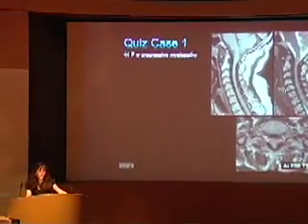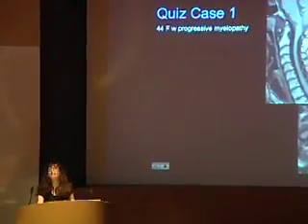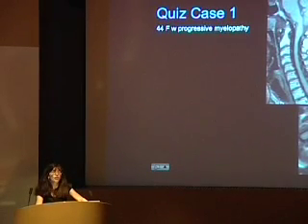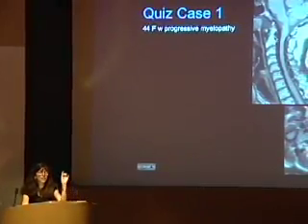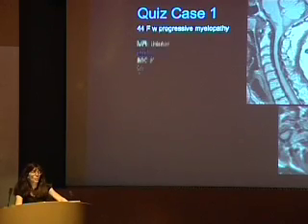So what else are we going to come up with? Okay, so lipomatosis, except it's not fat. But that's a good thought. Absolutely, fat in the epidural space can cause severe cord compression and myelopathy. So you need to think about some other sort of deposition or infiltrative process. So maybe it's amyloidosis. Okay, that would be a potential thought. What else could maybe do this? Rheumatoid arthritis. Okay, so rheumatoid arthritis with ligamentous involvement. You might expect to see a little more whittling of the dens, but you could actually wonder if her C1-2 interval was a little bit widened.